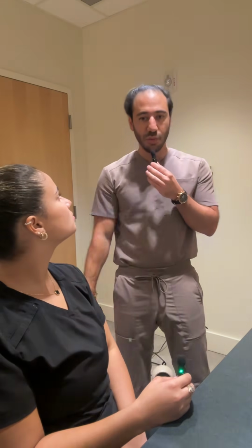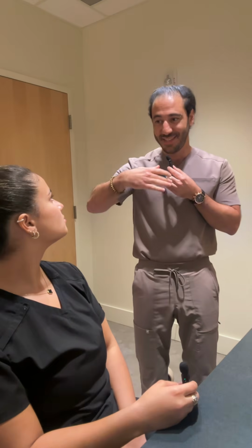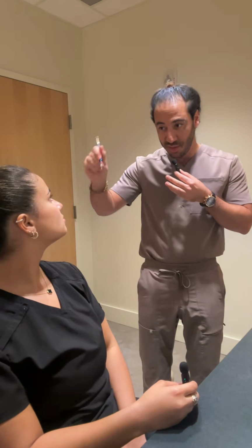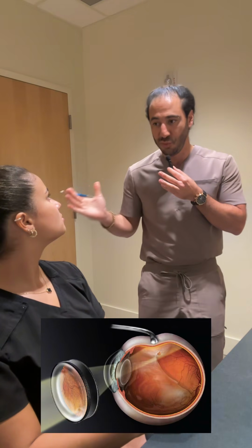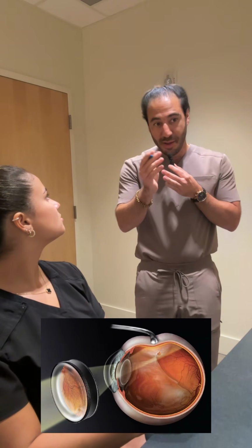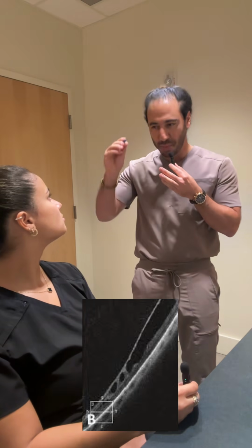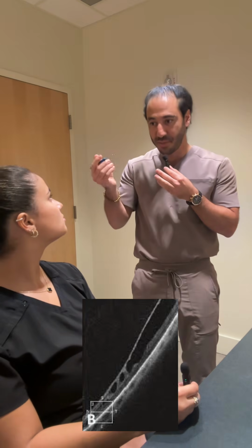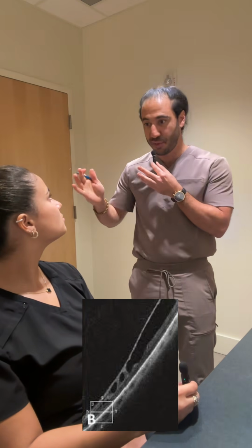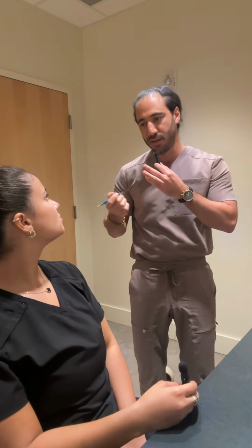And the last one we do is scleral depression. If it's a retinal detachment and the retina is detached and floating around, when you indent the eye, you can oppose the back of the eye to the retina and put them together again. A schisis is not this. In a schisis, the retina never separated. It's a split within the retina. So you're going to press with the scleral depressor and everything is going to move together. That's another thing we use to justify the fact that this is schisis and not a detachment.